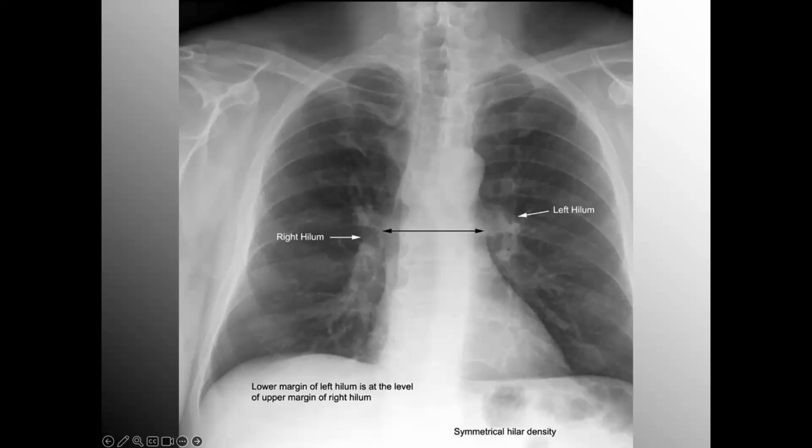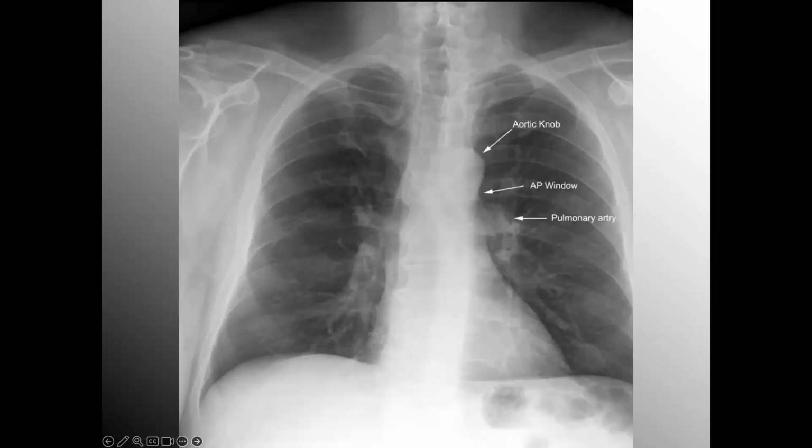You need to make sure, and rad techs are highly trained, they know what they're doing, that that X-ray beam is shot as perfectly centered as possible. And that's why you'll see those crosshairs show up on the patient's chest wall just before they say shooting X-rays. They're trying to ensure it's as centered as possible and not being shot superior or inferior.